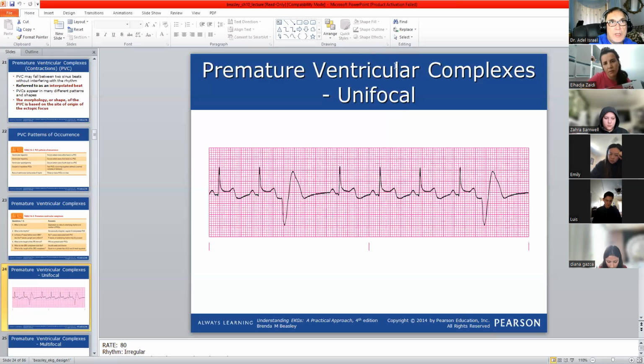So you put this one. One more issue. Is it mature or premature? It is premature. Why? If we compare this distance, it is equal, but this one is less. So this one is premature, and this one also is premature. So we put the word premature.